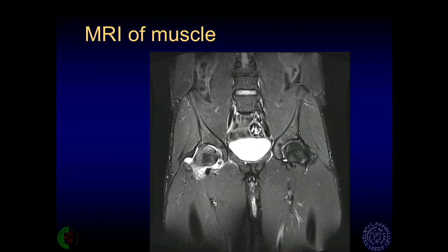You can tell this is a soccer player. He's got typical changes in his symphyseal cleft that we see in the UK. You can see he's lost a subchondral plate here on the left, and he's got a little bit of high signal just undermining the origin of that left adductor longus, and those are typical features of adductor disease and osteitis pubis with a secondary cleft sign. He's also got some hip disease. You can see some cartilage and labral damage superolaterally with quite marked edema in the femoral head and a little bit of edema on the acetabular aspect of his hip joint, associated with a large joint effusion and synovitis and debris in the hip joint.